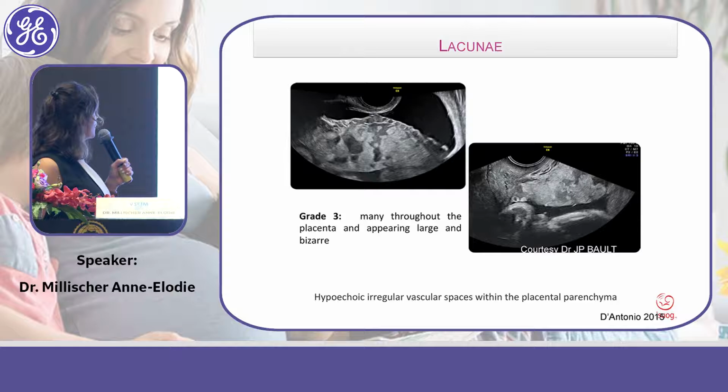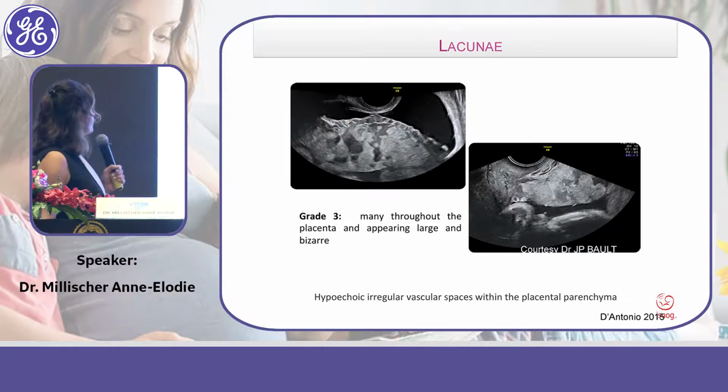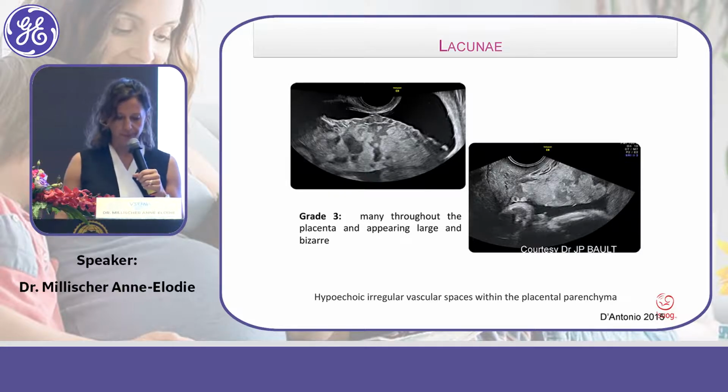It appears large and with irregular boundaries, as you have this on this picture, with no hyperechoic ring. Cái xoang mạch máu này, cái bờ nó không đều, nó ngóc ngách tùm lum và nó lớn, và đặc biệt là nó không có cái đường echo dày xung quanh.